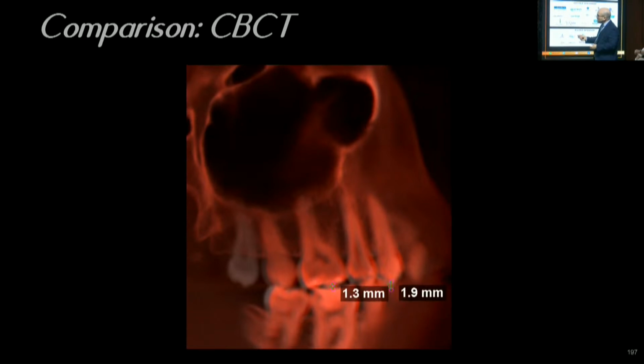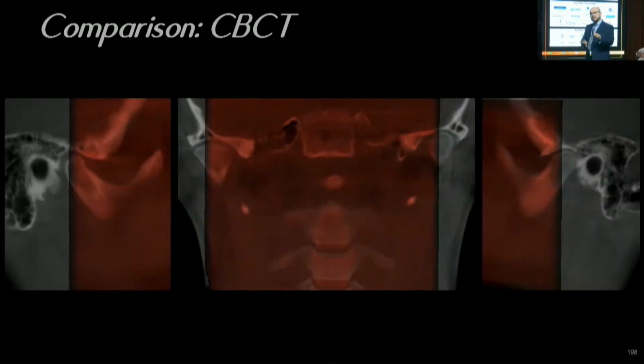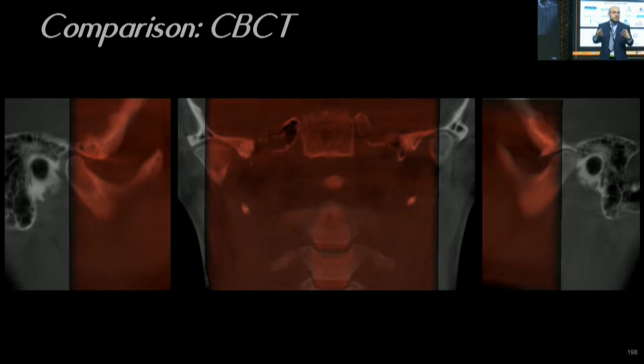Now, what did we do here? So we intruded about maybe 1.5 millimeters up to 2 millimeters, depending on where you do the measurements. Now, one of the things, of course, that I want to look at is her condyles. What's going on? Is the condyle severely displaced? Probably there is some rotational movement, but it's very, very minimal. So at that level, just doing the CBCT superimposition, I didn't detect much change, which means it's probably within a comfortable region within centric relation.